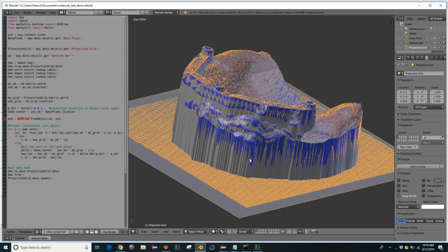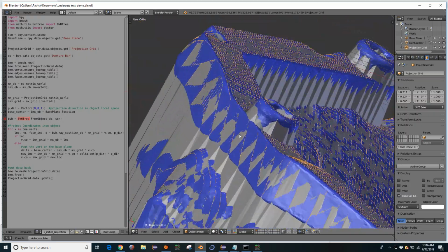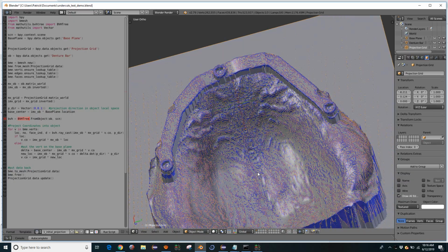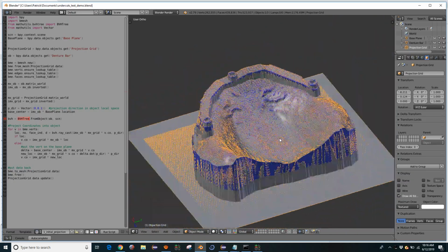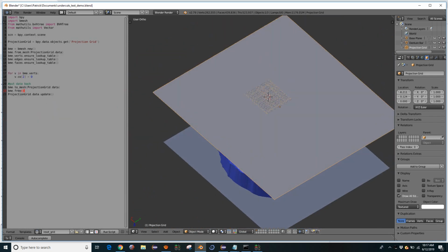Okay, but what we can see here is that we don't capture important parts of the model, particularly corners. And corners are fundamentally a very important area of the mesh to catch. So one technique for that, we might think, all right, why don't we just make our grid spacing smaller?